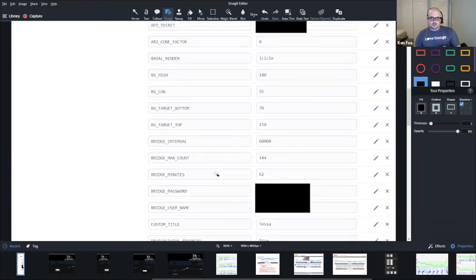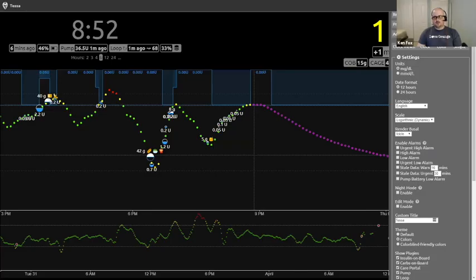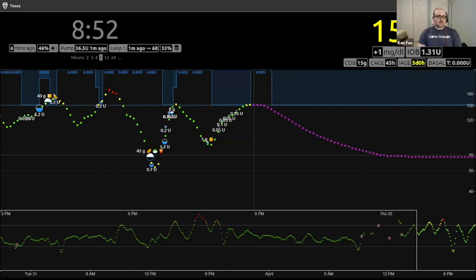Another one I'll show that's kind of unique. Some people, you guys experience this, where Loop is checking for new CGM values. So you see that I got an update 6 minutes ago. It should update any minute because I see I got a Loop update recently. This is how long ago it got the CGM value. And for some of you, you might be experiencing a situation where you have to wait about 7.5 minutes between each reading. And the reason is Nightscout by default looks out for a new CGM reading every 5 minutes.